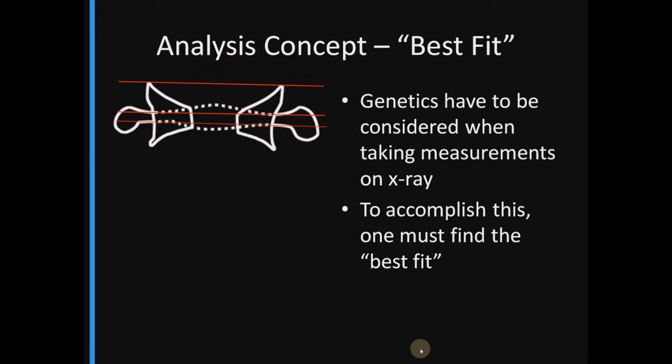So if we were to draw a line on the top of the superior tips of the atlas, and draw a line through the inferior tips of the atlas, and draw a line through the inferior attachment of the posterior arch to the lateral mass, and the superior attachment of the posterior arch to the lateral mass, we would have 4 reference points of the atlas. We could compare each of those to see how well they agree on the plane of reference for the atlas bone.